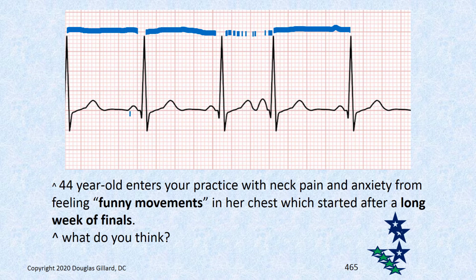And first of all, look at the morphology of our P wave. It's about 1 box high, 1 box high. And look at this P wave. So it's 2.5 boxes high. So this is obviously not coming from the SA node. Also, the PR segment is shorter than this one. But you can just tell by the morphology that's not right. And the rule is, now where's it coming from? Well, if it's upright, it's right. Right is right. So it's coming somewhere from the right atria.